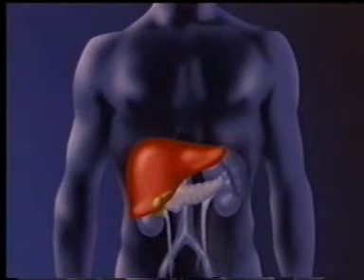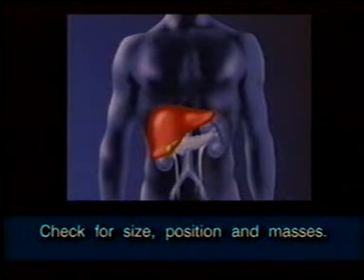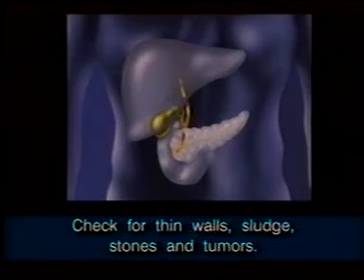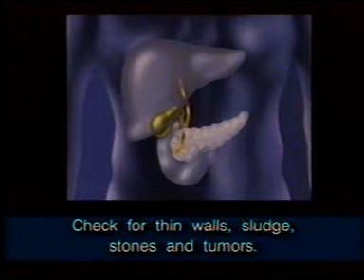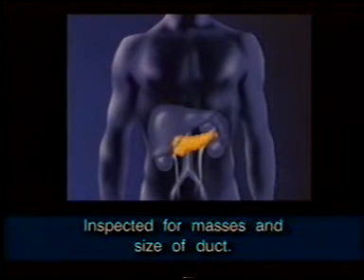The hepatic exam investigates the liver, gallbladder, common bile duct, and pancreas. The liver is checked for size, position, and masses. The gallbladder is examined to see if the wall is thin and free of sludge, stones, and tumors. The common bile duct is scanned to see if it is enlarged. The pancreas is viewed for masses and size of the duct.